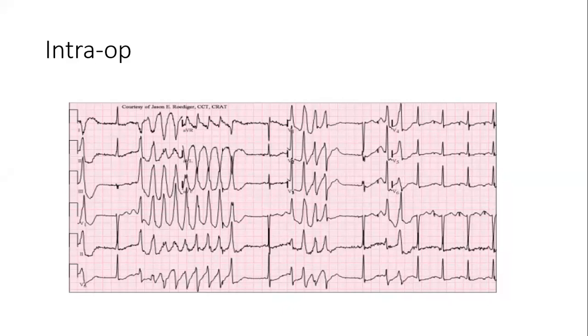Dineo, can you help Ayanda? Can you repeat the question, Doc? What is this? The question is that simple. For me, it looks like the patient has got ventricular broad complexes, so it's a ventricular tachycardia.